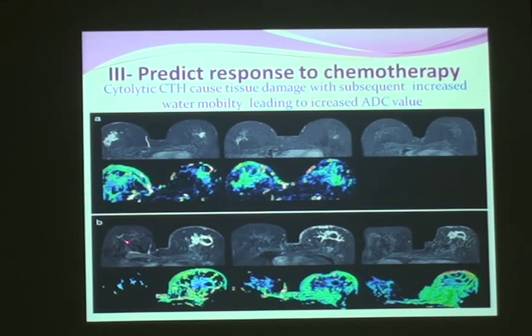Number A, this is fortunately a very good response. The point is, I can detect it very early, in a short duration, as short as 4 to 5 days. It's very hard to assess response after chemotherapy with mammography or ultrasound. It's not very reliable due to the changes, but here, just before we complete one course, we can determine that it started to lose diffusion.